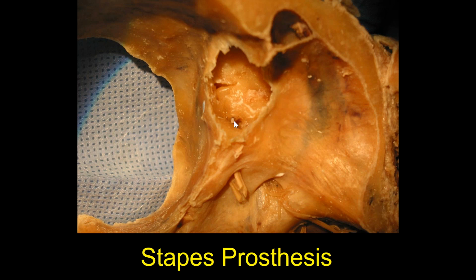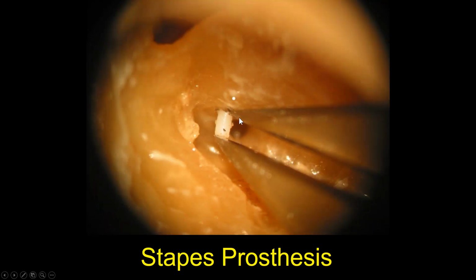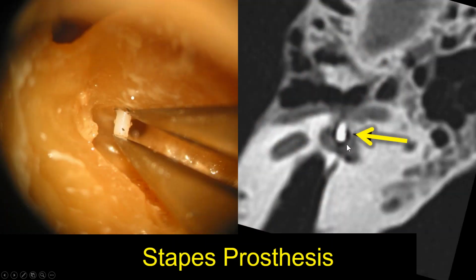And we tried to measure exactly how much, if we cut into the vestibule on the other side, of the prosthesis we actually see sticking out into the vestibule. We measured it with calipers to see how much was sticking out. And we compared that measurement with how much was sticking in on the CT examination.